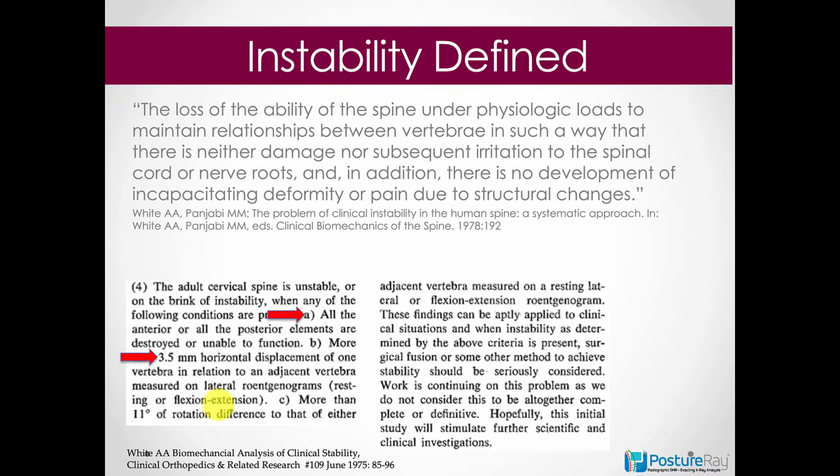Biomechanically, researchers like Dr. Deed Harrison have a problem with this, because if you have normal stair stepping of, say, 1 to 2 millimeters, which could be classified as subluxation, you're within that realm of possibility that cumulative net movement shouldn't be classified as true instability based on the guides. So that's our interpretation of it. But again, if you're using the guides, we updated PostureRay to go specifically with the guides when you're using the quote unquote end plate instability report.